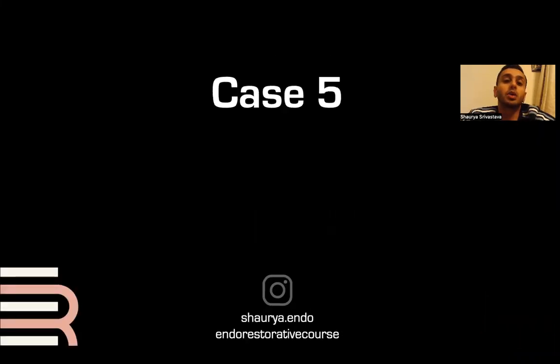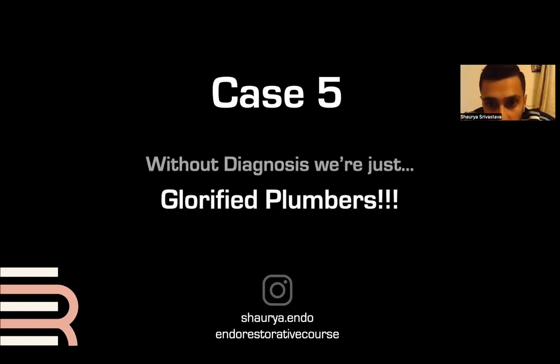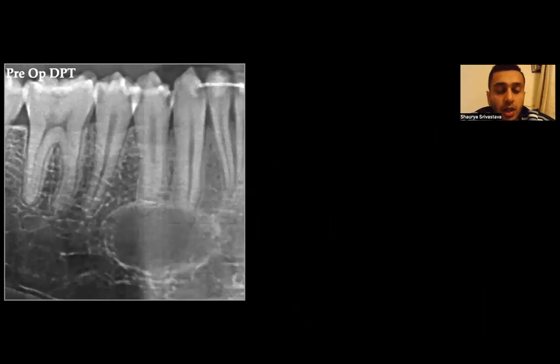All right. So case 5, as I said, without diagnosis, we're just glorified plumbers. This was the case that was sent to me by a dentist from a hospital. And this is exactly how the images were sent to me as well, on paper as a printout. Okay, so with a DPT that was taken, you can see there's a lesion encapsulating the 3 and the 4. The dentist sent it over because they said that they can't get down the canal in the 4, all right? And they'd already started treatment on these 2 teeth.